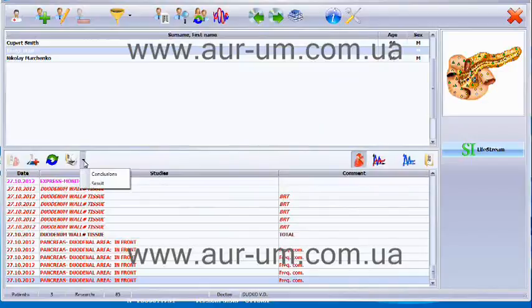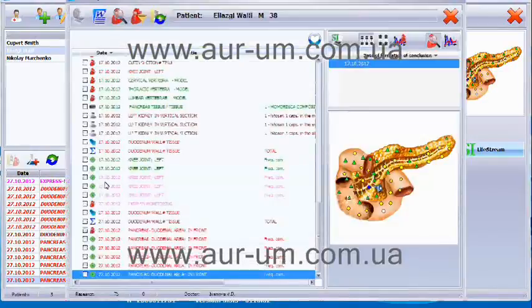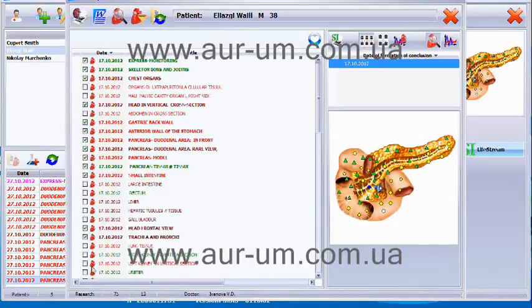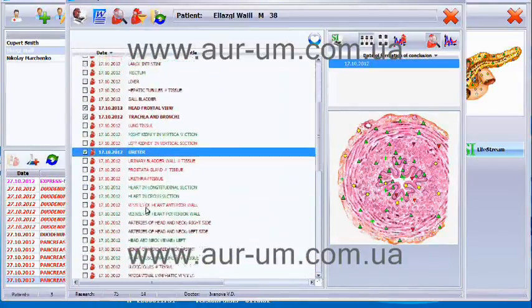The second thing we can do, we can also save or print out the results, so basically the pictures of the organs. We select them, we check the ones we want to print from the left, the organs you want to show to the patient. They will be printed with markers, so that's especially beneficial. And we use this function, printing selected organs.